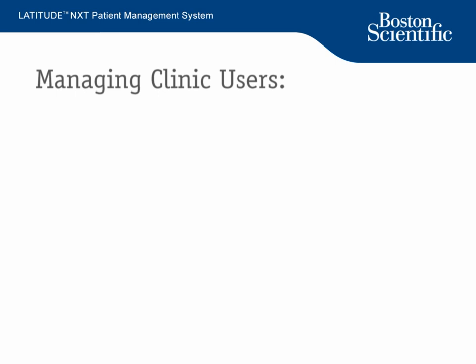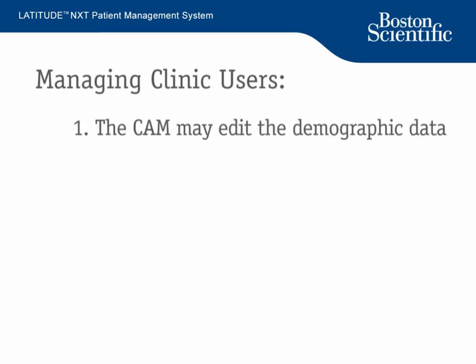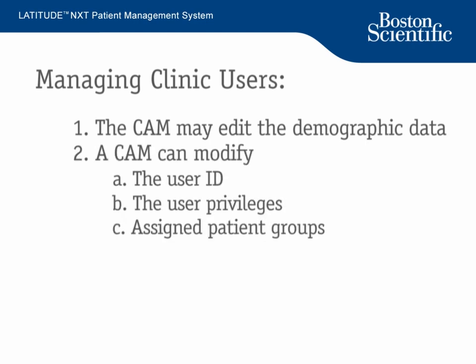Here are a couple helpful things to know about ongoing management of clinic users. The CAM may edit the demographic data from any user and save it into the Latitude NXT system. The demographic data a CAM can modify includes the user ID, the user privileges, and assigned patient groups. Third, in the event that a user forgets his or her password, a CAM can assist by resetting a user's password. We will discuss this more in a moment.